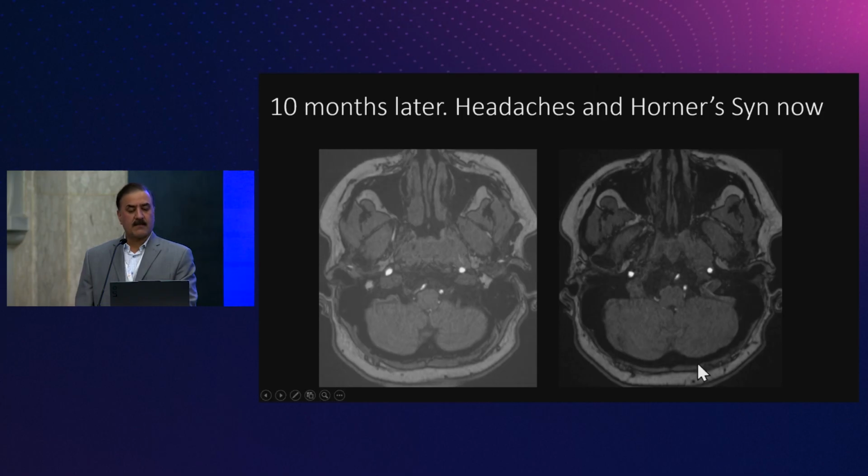And this is now the patient presenting with Horner's syndrome, and that is because it is extending down into the carotid sheath. Fortunately, as I said, we don't do surgeries; otherwise if this was any other cancer, it would have been an inoperable stage 4B. But here it stays at T2. Still, it was nonetheless missed for about 1.5 years, and this was finally picked up on this MR angiogram image.